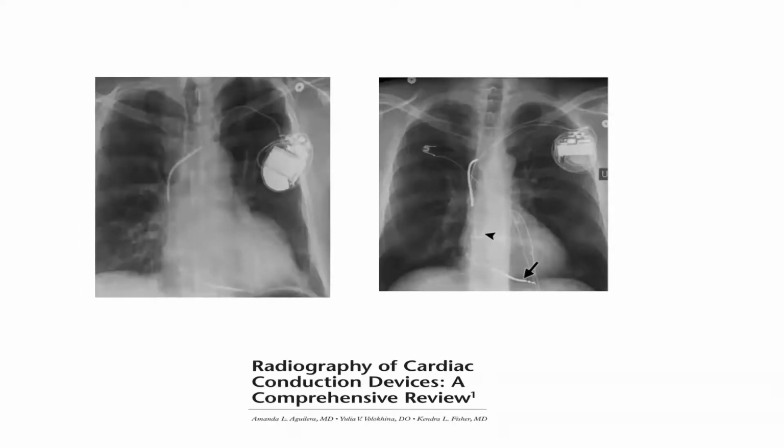Now, what is this device? ICD. Yes, ICD. Why? Because of the two coils, this one and this one. Okay. Now, what is this? ICD. Yes, dual chamber ICD. This is a single chamber ICD. Again, this is ICD because of this coil and this coil, and you see the RA lead is here. Okay? Clear so far?